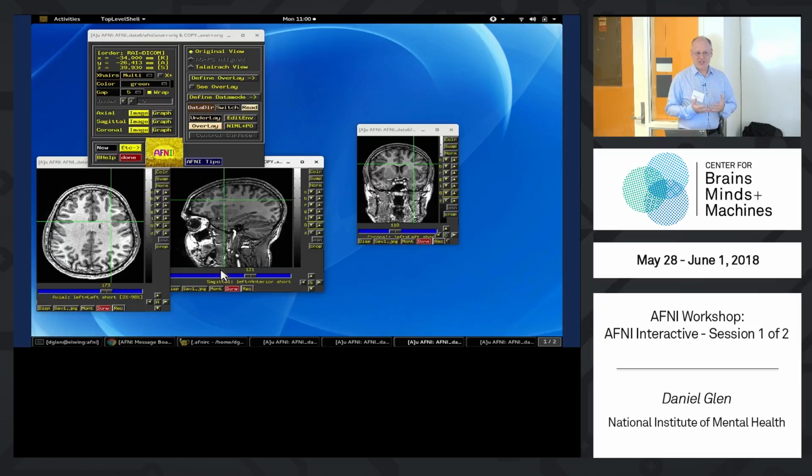It doesn't matter how your data is stored. We don't have any requirement that your data is stored in a particular way, other than it being in a correct way, meaning that the order is defined properly. So if you're acquiring animal studies and they're flipped over, we may not know that.